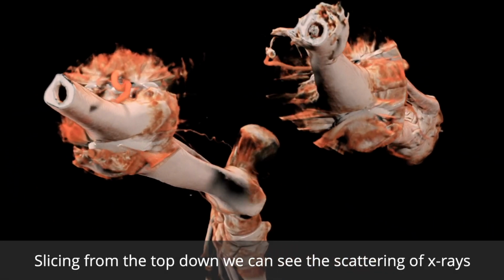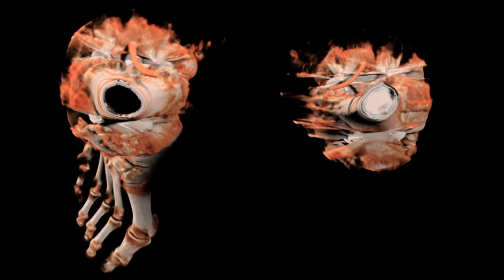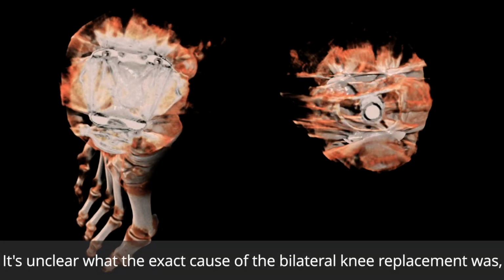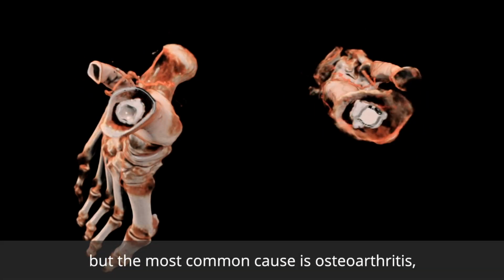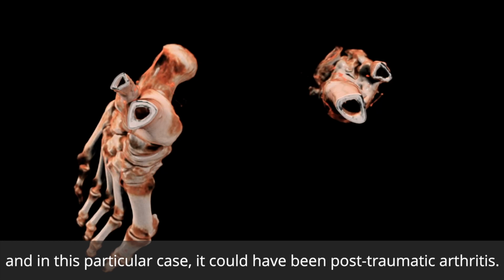Slicing from the top down, we can see the scattering of X-rays as we pass the metal of the knee replacements. It's unclear what the exact cause of the bilateral knee replacement was, but the most common cause is osteoarthritis, and in this particular case, it could have been post-traumatic arthritis.